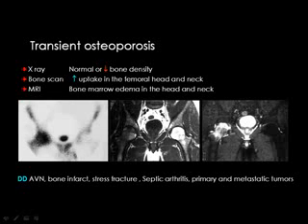And in bone scan, you will get increased uptake in the affected hip. The opposite is seen in avascular necrosis because of the cutting of the blood supply. You get a photopenic area in the affected hip. On MRI, you can see bone marrow edema in the femoral head and neck, which is bright in the STIR image. Also, some synovial effusion is usually present in the diseased hip.